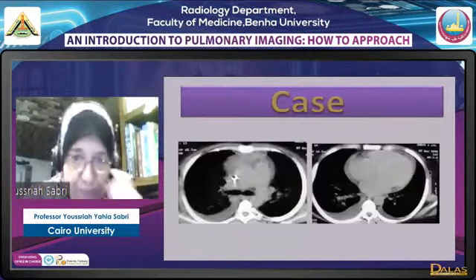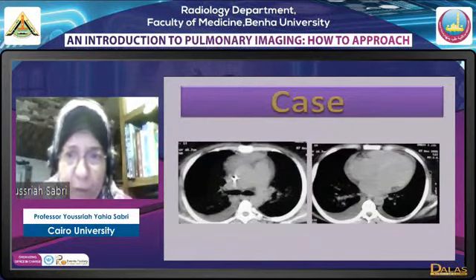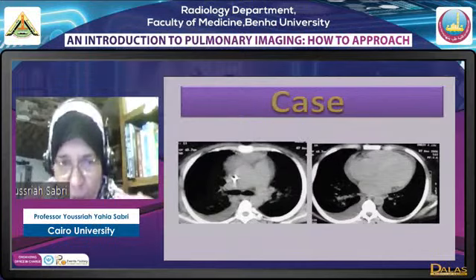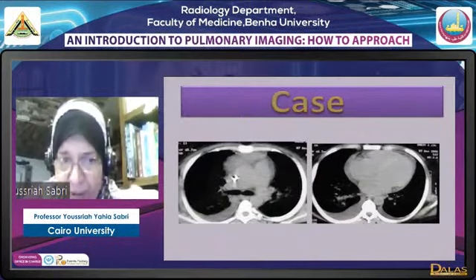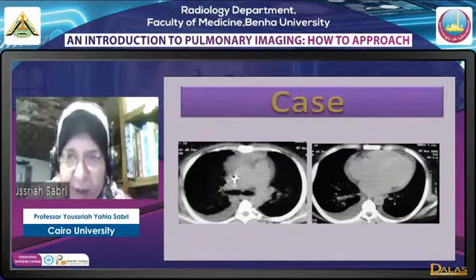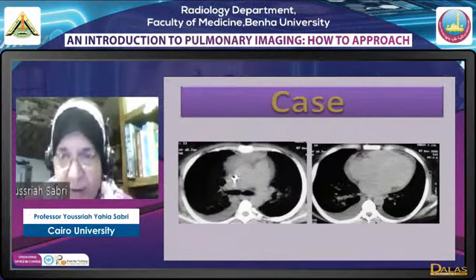Now, here also, we have bilateral pleural effusion. Also, there is a pericardial effusion. The effusion in both cases is parallel to the rib. The anterior margin of the effusion is parallel to it and concave. So this is a free effusion.